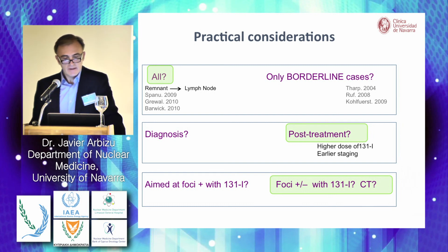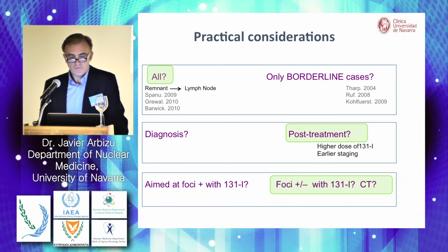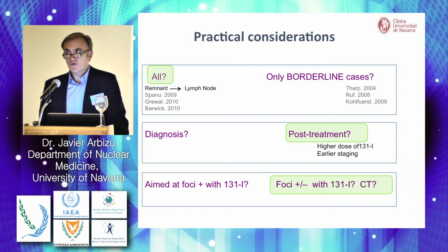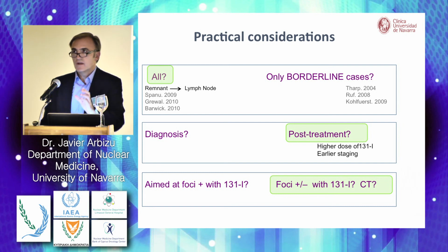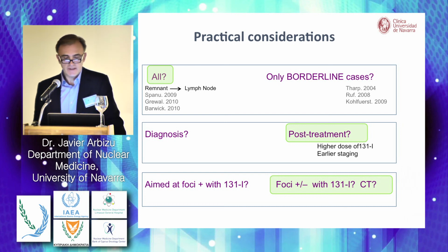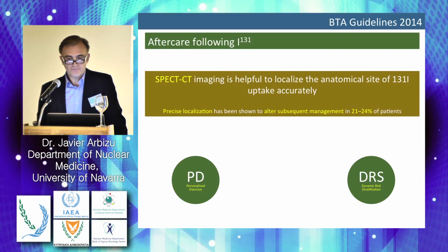In these cases, from my point of view, with equivocal foci with some uptake, you can use the CT in order to look at the structural lesion and see if this structural lesion has an increase or decrease of activity on the CT.